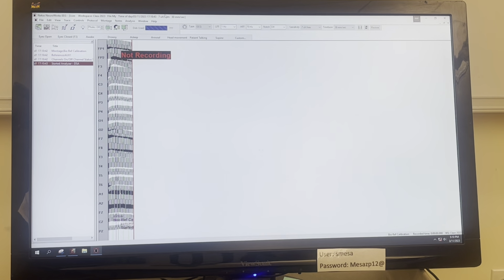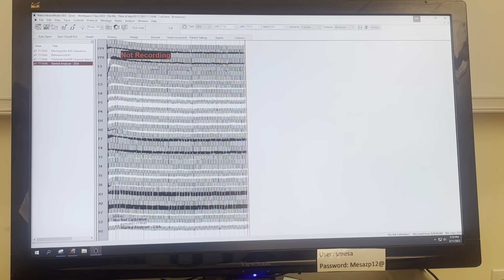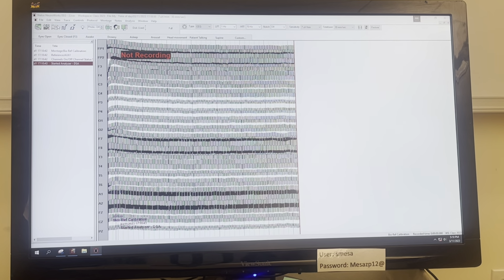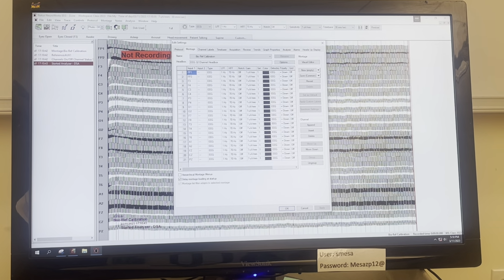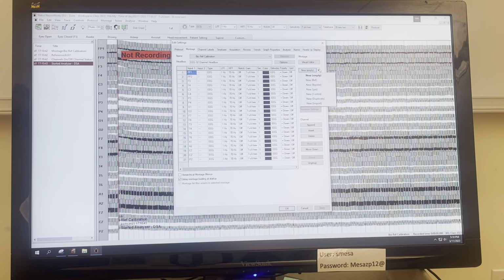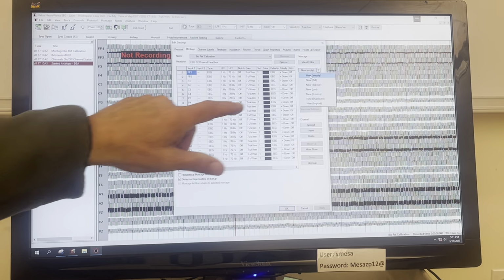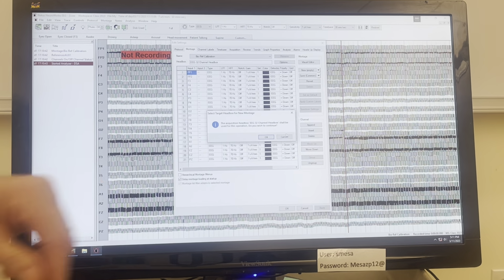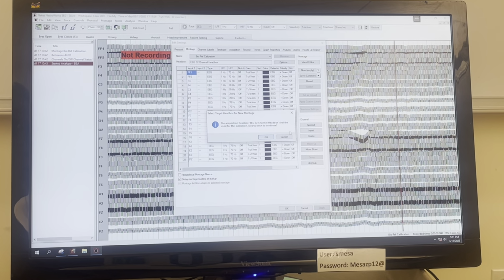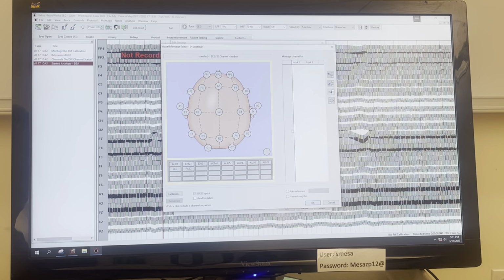All right, and okay, so to create a new montage, you go up into Edit, hit Settings, and what you do here is you want to do a new montage, okay? So you click New, and then it's just going to ask you what head box you're using. So you just hit OK. You just confirm it by hitting OK. So it's going to come up with this visual editor, okay?